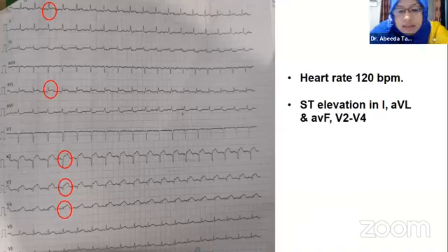Abida? Sir, yes, sir. There is a Q wave in V1 to V1, V2, sir.